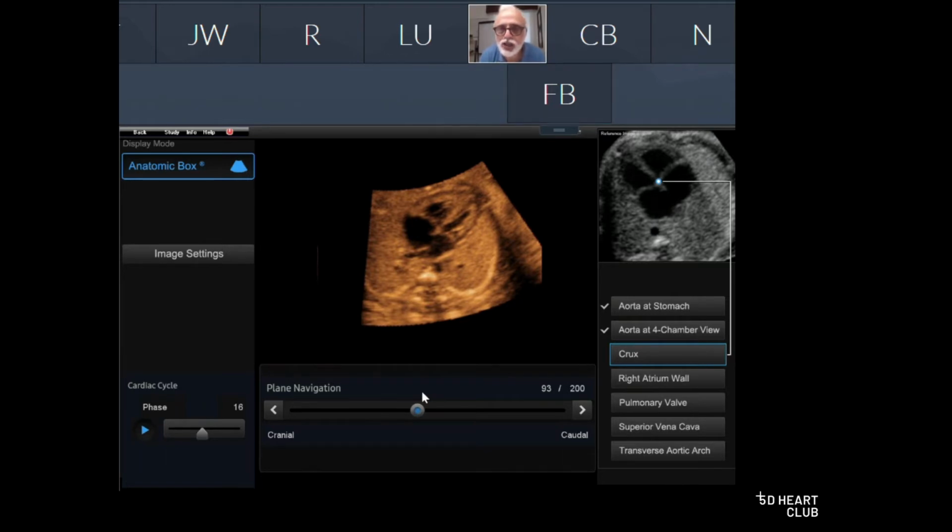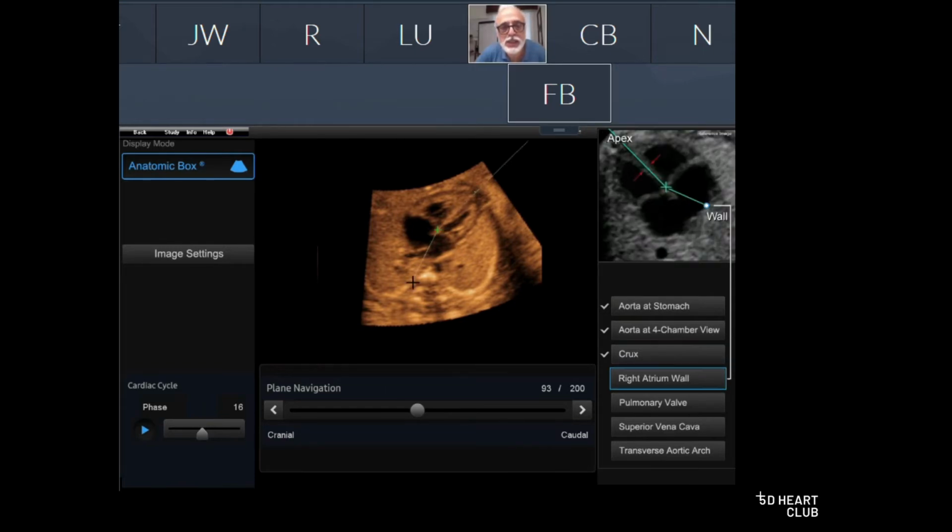So what is the crux of the heart? The crux of the heart is a single point where both valves are joining. That's the spot. Click. So put the cross over the wall. Over the wall. The cross is too far from the wall. Okay. Yeah, on the wall, and now align the septum, please. Oh yeah. Yes. Okay, that's too much. Okay, good. That's the point. Click.